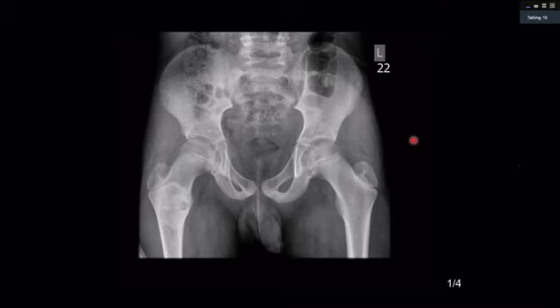I would be specifically concerned about this lesion if the patient presented with pain. In terms of the likely etiology, I think it has appearances consistent with fibrous dysplasia, in which case I would like to assess whether there were clinical reasons to suspect polyostotic disease and image other areas of the skeleton accordingly.